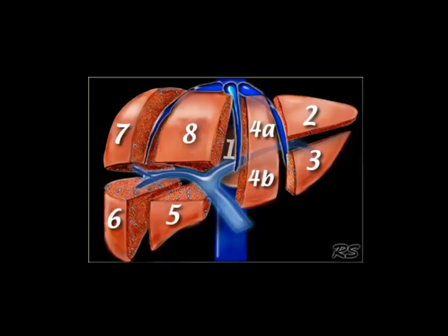This is a problematic area, liver. If you are doing non-contrast CT, then it becomes very difficult because the landmarks are the portal vein and the hepatic veins. So if you are describing the lesion on FDG PET, I try to give the segments.